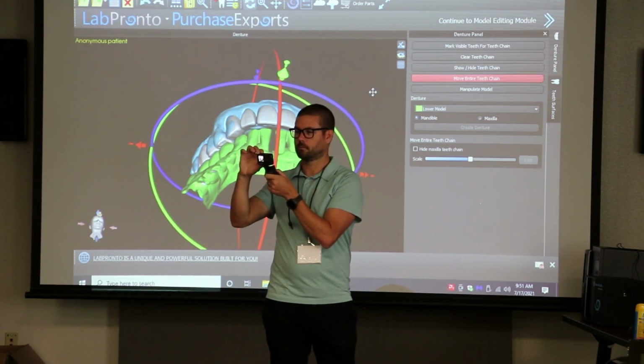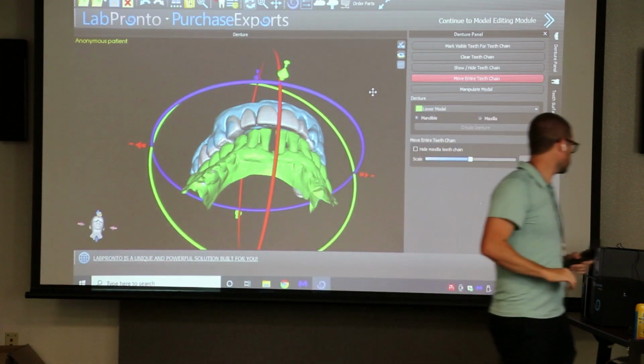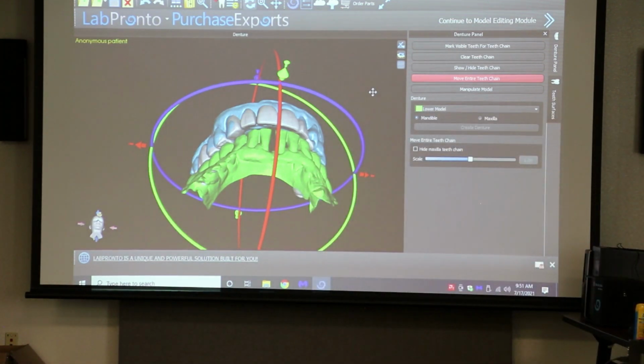And then you're gonna. I see my incisor keeps coming out. Keeps coming off. So what I do, shift click anywhere. Just get them into the scene, basically. By shift clicking, you're just gonna drop the whole arch into the scene, and then you can start spinning around.